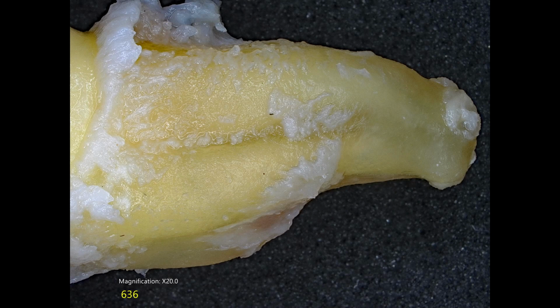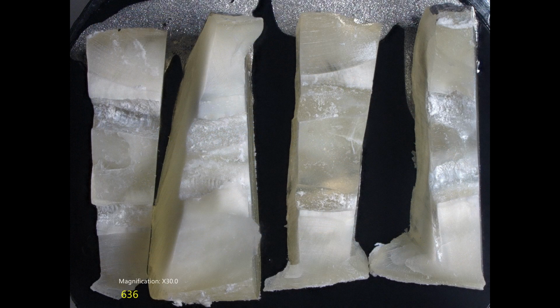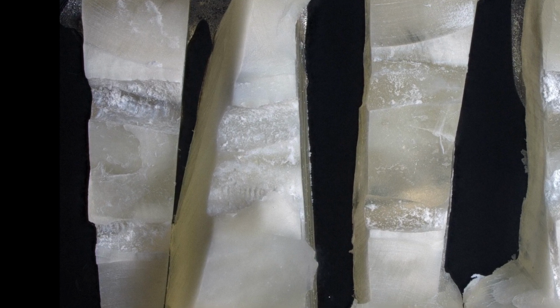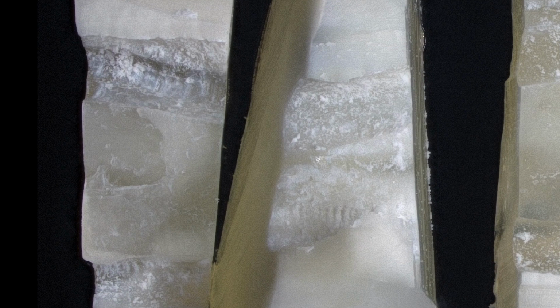Those were my x-rays. You can see that it is a fused root. These present real problems in evaluating. So I decided to try a hybrid approach. One side of the root I tried to section sagittally. The other section I cut axially and then took those axial slices and cut them in half so I could get some way of looking at the axial dentinal wall.